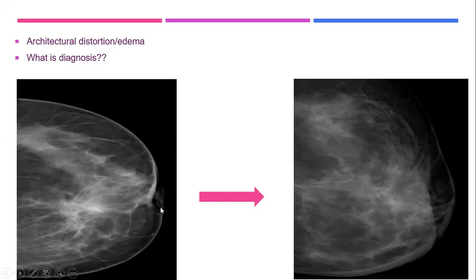Could you see it? Could you appreciate it here? It's more here in the recent image. But what does it signify? What is the significance of that? So it's either disease progression or consequences of the intervention. If it is acute, I mean, if the image was taken shortly after the surgery. No, this is post-surgical, Abir.